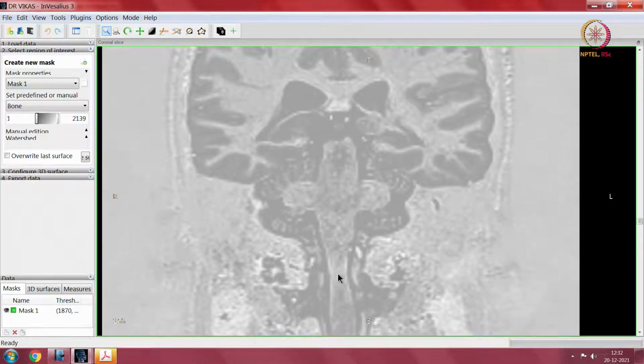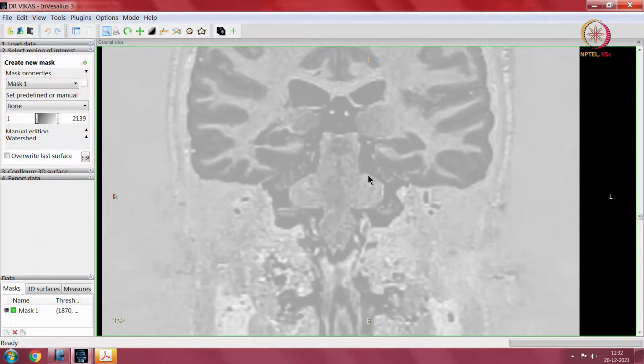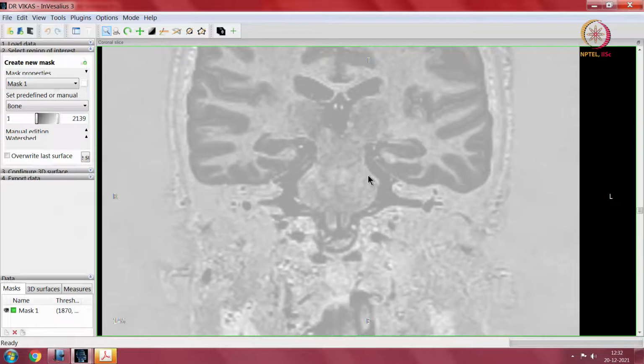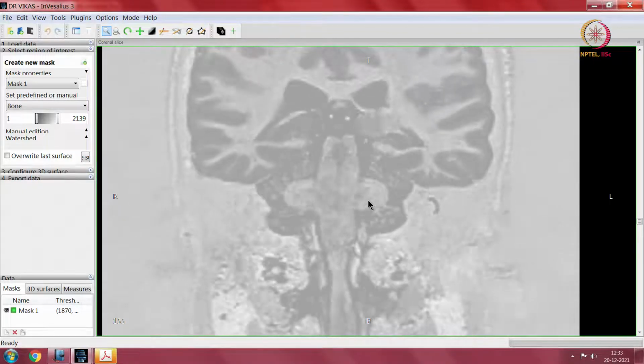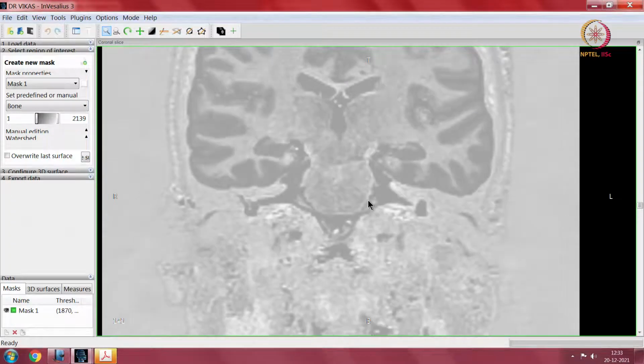Spinal cord, medulla, there is this bulge which is coming over here, which is the pons, and upper part is the midbrain. Not very obvious as it was in the axial sections, but it is there. So, you can make out the size discrepancy between the two, which I tried to highlight in my 3D model. So, this is the medulla, the bulge of the pons, and the midbrain, which is somewhat bigger than the medulla.